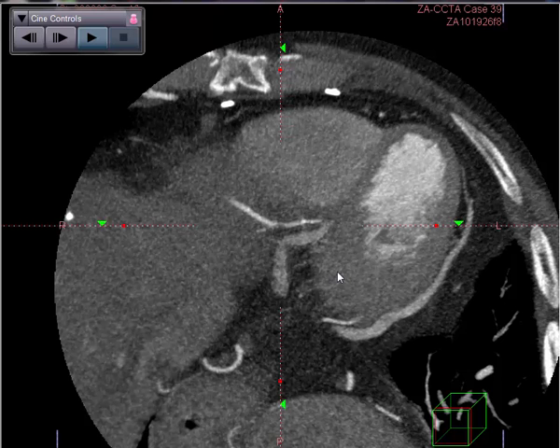There is a 5-way bypass graft with 4 conduits, so-called 4x5 bypass grafting. However, there were several situations of concern. We can't absolutely rule out any stenosis in the mid portion of the graft to the right coronary, nor its anastomosis with the PDA.